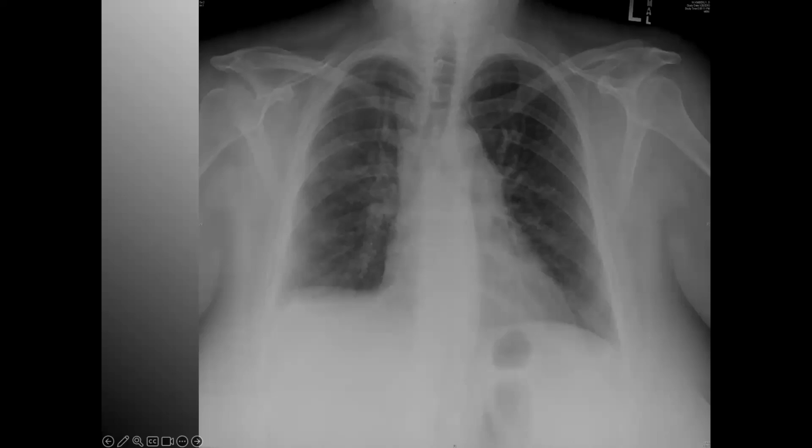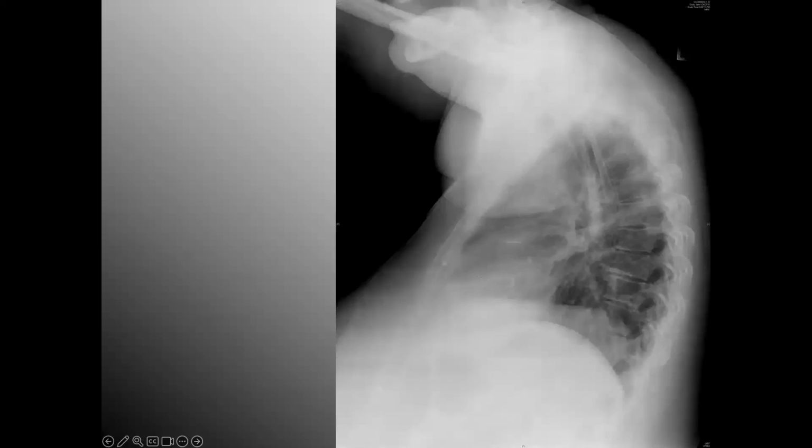And if you've been sleeping up until this point, you can take this one the rest of your career. If you've got volume loss and it's from atelectasis, remember atelectasis pulls towards itself. You're going to have a shifting of the mediastinum, maybe even tracheal deviation. With a pleural effusion, that collapse of lung tissue is filled with fluid, so you don't have the ability to create sort of that vacuum where it pulls towards itself. So with an effusion, there will be atelectasis present, but the underlying primary, if it's effusion, you won't have as much shifting towards the affected side versus atelectasis where you have shifting towards the affected side.